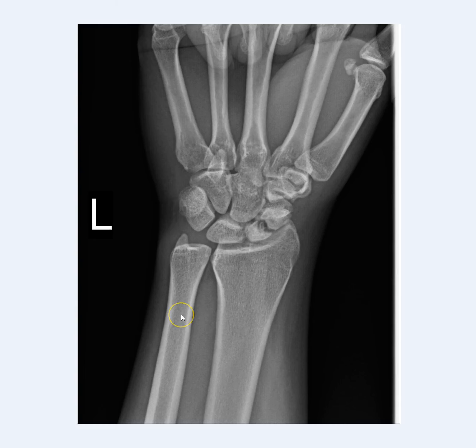So, we can discuss the images that this patient received. The first few images are preoperative. This one here is an AP view x-ray of the left wrist. You can see here there is a displaced scaphoid fracture with a 2.6 millimeter fracture gap present. There are also sclerotic changes of the proximal pole of the scaphoid, which may represent avascular necrosis in this image.